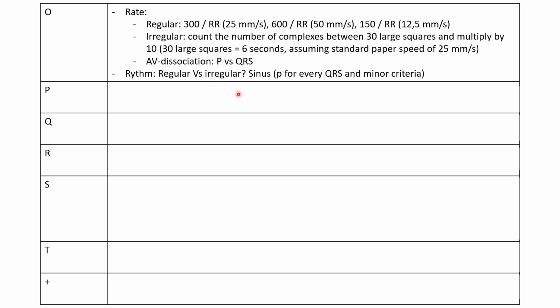And then you have something called irregular if there's no pattern to the irregularity, right? So in sinus arrhythmia, there's a pattern to your breathing in and out. You can see the spacing in between becomes narrower and then wider and then narrower and then wider.